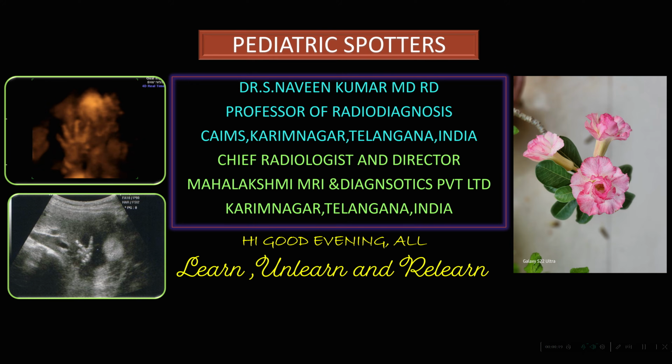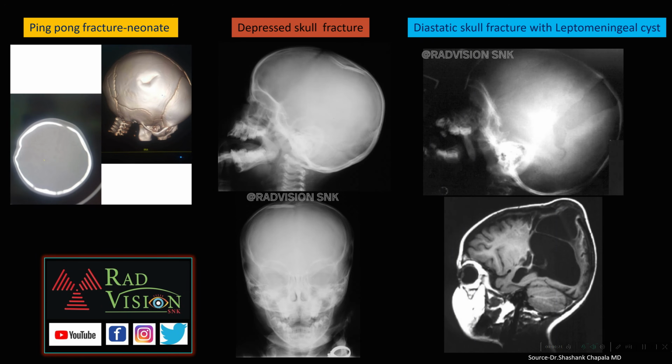So coming to the Pediatric Spotters, first we will see here. You can see this is a neonate where you can see there is a depressed skull fracture. This is typically called as ping pong fracture, where there will be depression. This is nothing but the depressed fracture in case of neonates, and sometimes in these cases the fracture line could not be visualized clearly. So depressed skull fractures in case of neonates is nothing but ping pong fracture.